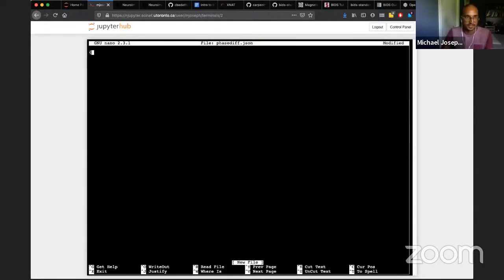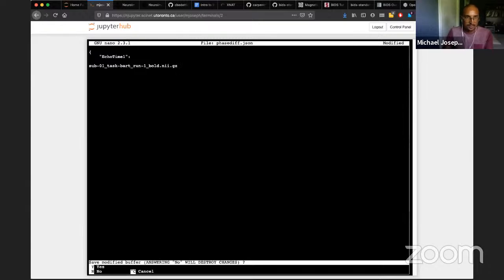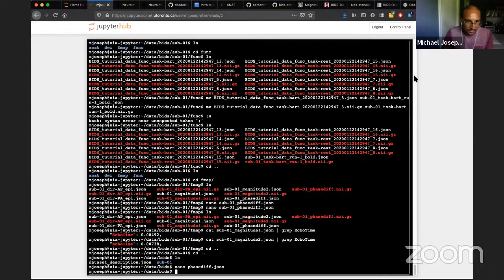So here I'm just going to add echo time 1, 2. Oops. I forgot what they were. Okay, 492 and 738.